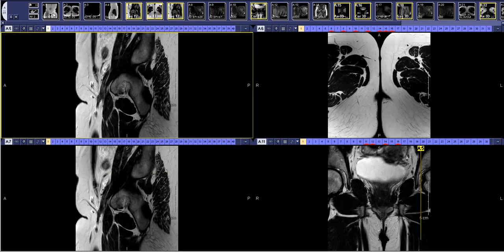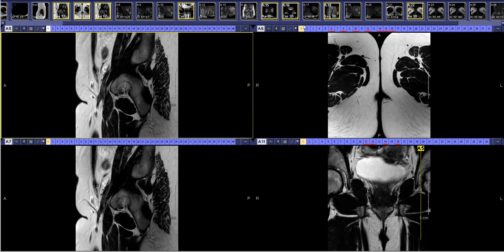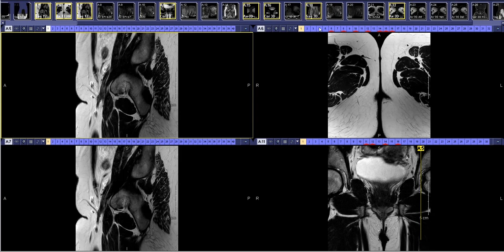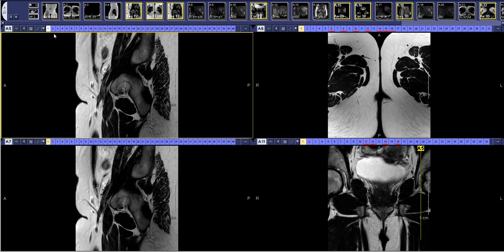So this is our fistula protocol MRI. It's very similar to rectal cancer protocol. The difference is that there is some diffusion imaging in there, and we do a little bit more post-contrast imaging. So to start out, the workhorses of this are going to be your high-resolution T2 images.